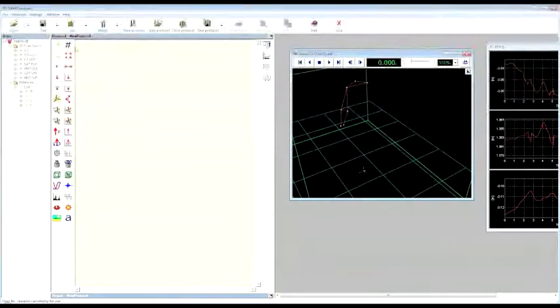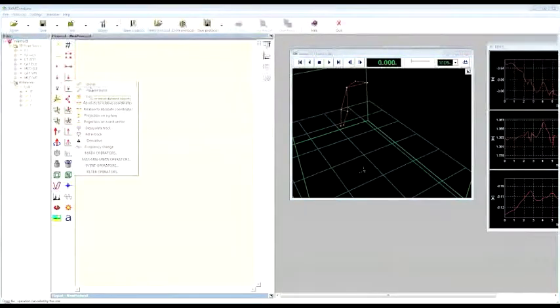So for example, I need to know if it is a scalar, if it will be an angle, a velocity, or an acceleration, and so on. So for example, if I'm going to compute an acceleration, I have to look inside the acceleration blocks. Okay, because at the end of the operation, the output I'm going to have will be an acceleration.